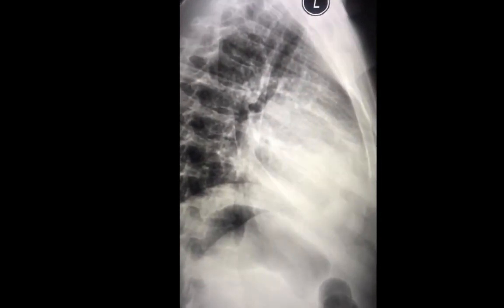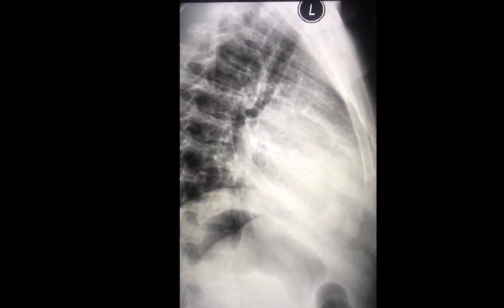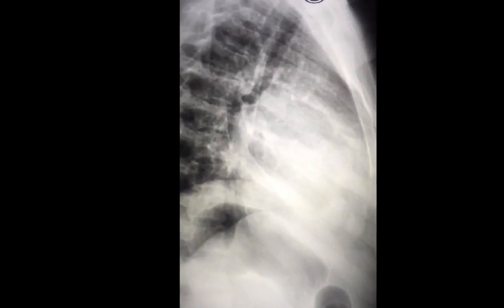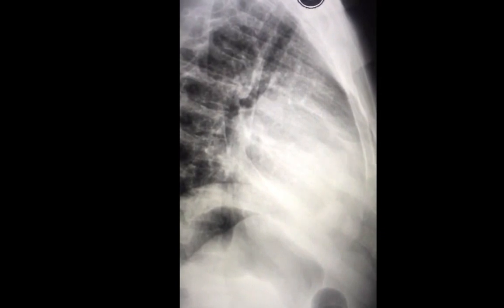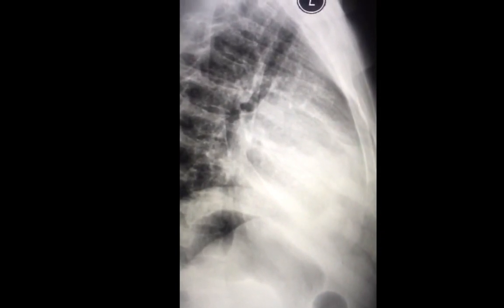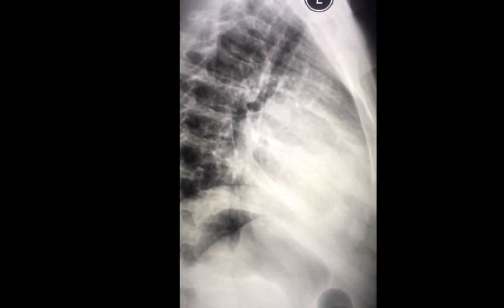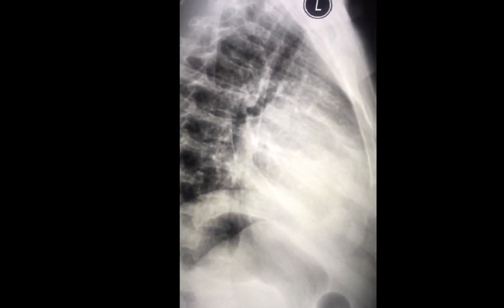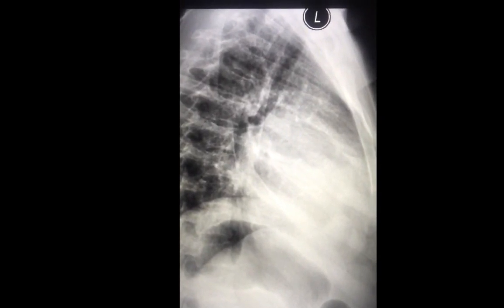We also learned that there is the pericardium that is thin, surrounded by outer pericardial and inner epicardial fat. We learned that fat is of low density on a CT scan and of a relatively lower density than soft tissue on chest radiographs as well. Knowing these facts, the pericardial and epicardial fat surrounding a dense fluid within the pericardium is a sign of pericardial effusion. The sign is famous for being called the Oreo cookie sign.